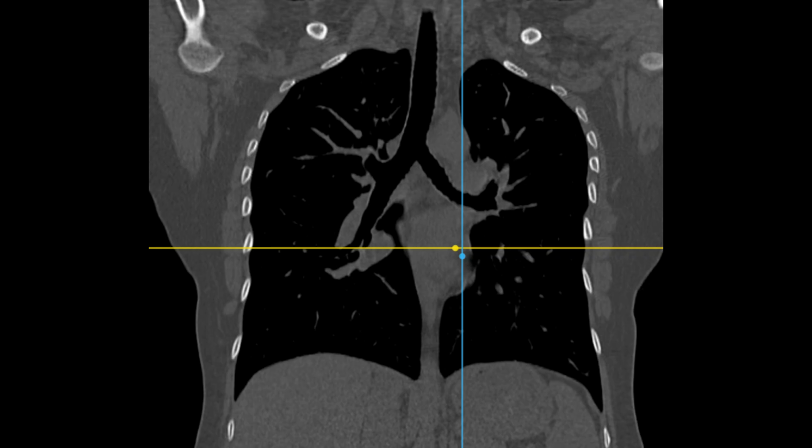Between the lungs lies the mediastinum, though in this particular slice, soft tissue structures such as the heart, major blood vessels, or lymph nodes are not distinctly shown, likely due to the specific window settings applied to emphasize lung parenchyma. Lung window settings typically increase contrast between air-filled spaces and soft tissues, making the lungs appear darker while reducing the visibility of other mediastinal components.